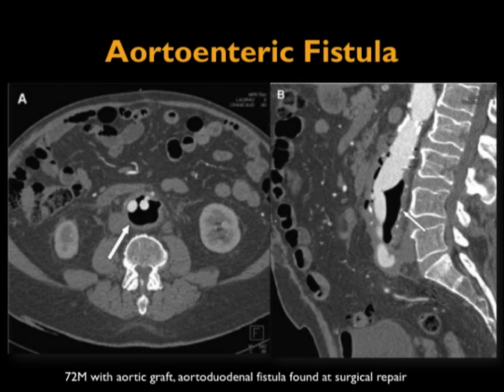We can see all sorts of fistulas with inflammatory bowel disease, to vessels, as in this case. We spoke about to bladder. We talk about to bowel. We talk about to muscle. So we can see all of them.